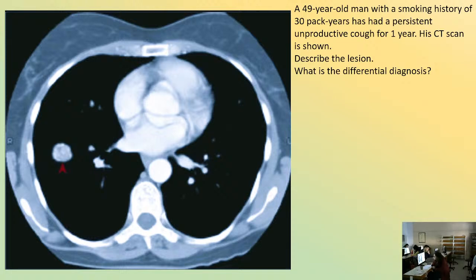What would you think it may be, taking into account what we have already discussed? Yes? Since we see the two lungs filled with air, and then we see some kind of tissue without air. So, without air, what can this be then? Think, what can this be?